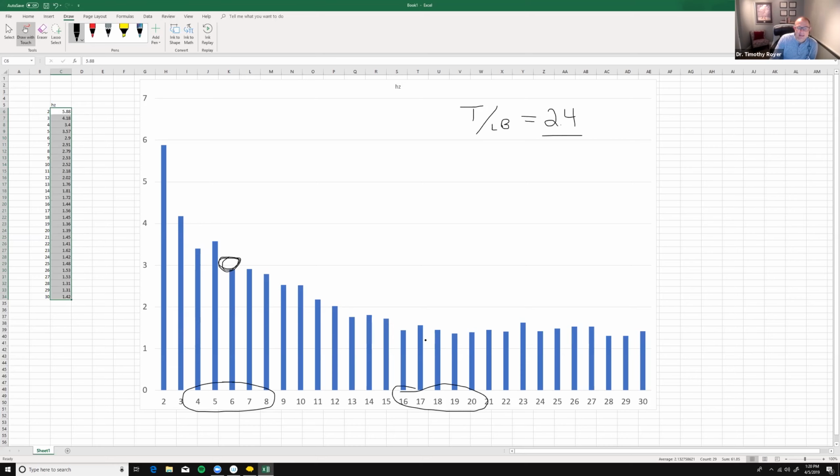And we can kind of see that here. Actually, I'm a little bit higher in my low beta. So this slope right here is actually pretty close to what we're looking for in a brain where the theta ratio is right around 2.4. Now we can calculate exactly what that slope is, but it should look something like this.